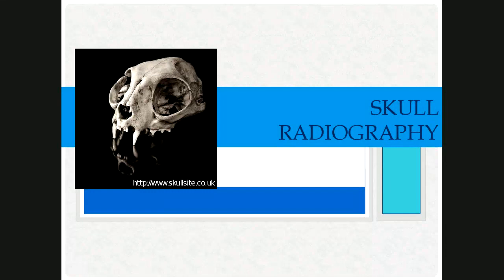The skull is symmetrical, so comparison of the two sides is helpful. Accurate positioning, centering, and collimation is very important to optimize imaging. And these days, CT has an increasing role in assessment of complex diseases due to its lack of superimposition.